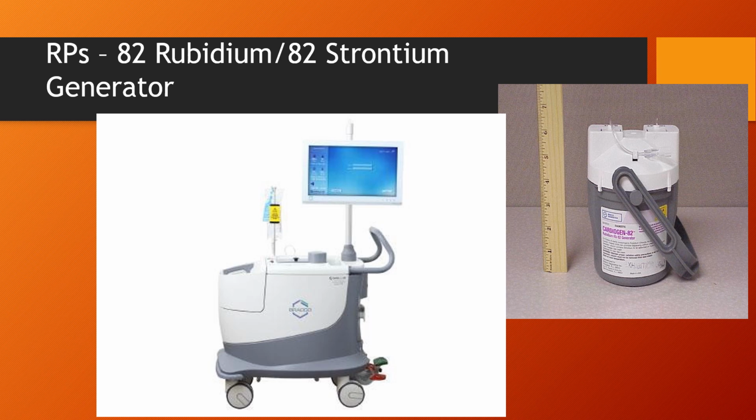And then the 1700 cart, which is the newest model at the time of this recording, has a barcode scanner to make sure that it truly is saline. And typically, best practice is that it should be checked by 2 people to make sure that it really is saline.